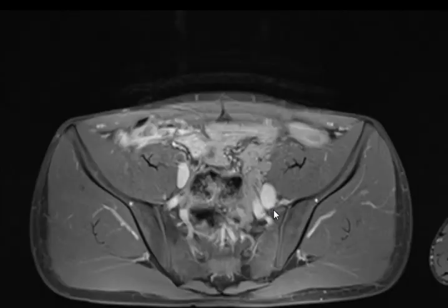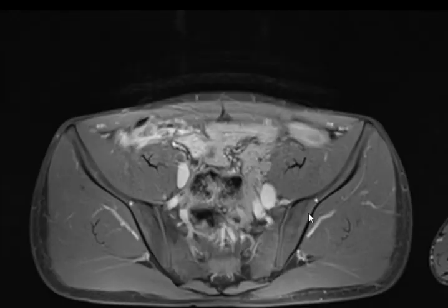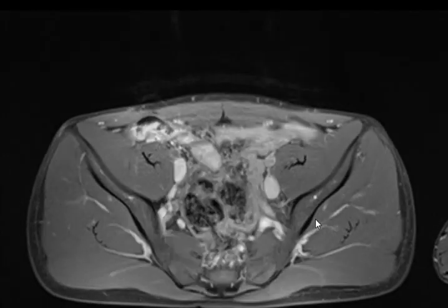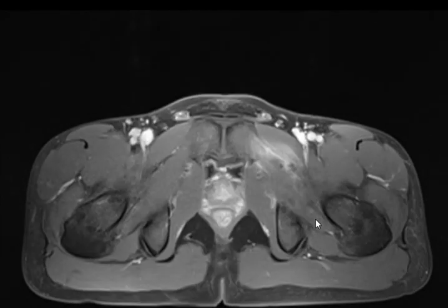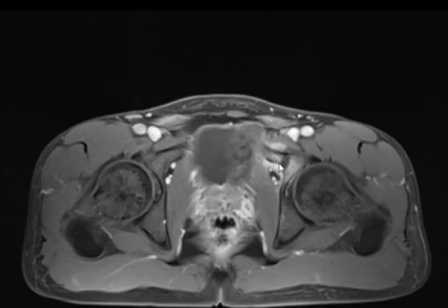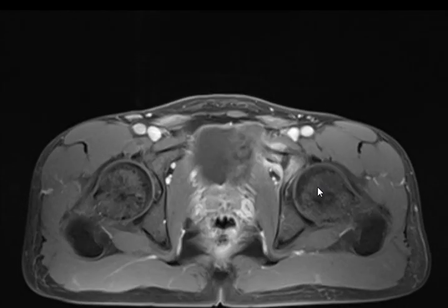One more finding. Find it and we will start concluding, let's say. Here on this. Go up. No, no. Okay, go down. Keep going. Okay. Now what? Go down a little bit. Opposite, opposite. Also here. Exactly. Also here. So, what's going on here? The same as that. There is a high signal within the muscle and the bone. Beautiful. It's almost the same pathology.